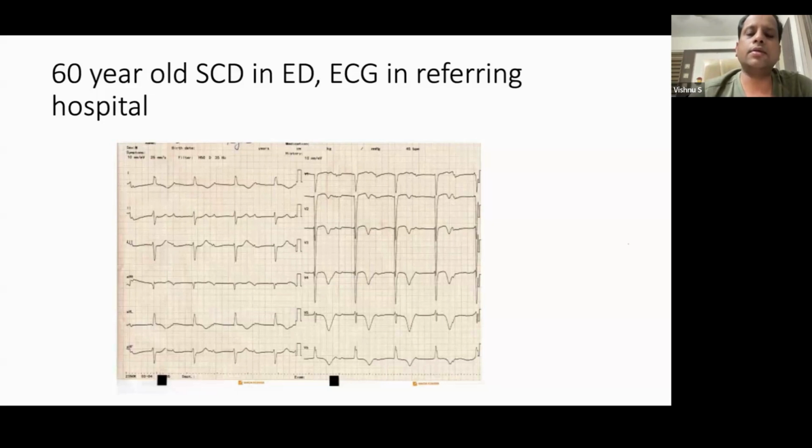So analyze the ST segment for inferior MI, the QT segment for QT prolongation, and the QRS segment for a wide QRS escape. That is important in a patient with complete heart block. Seeing complete heart block alone will not yield enough. You have to look more into the QRS, ST segment, QT interval and T wave.